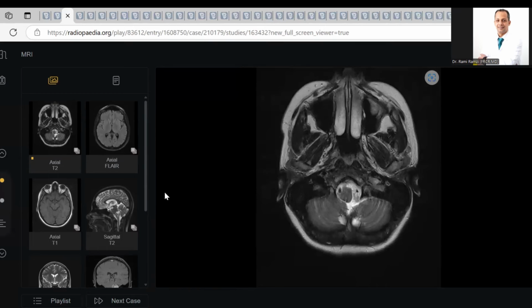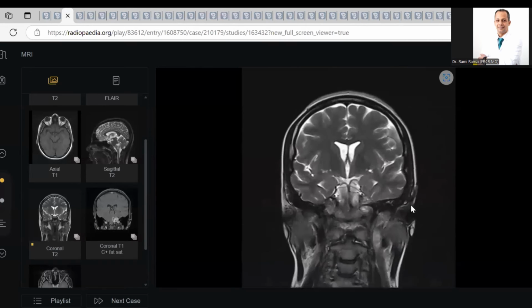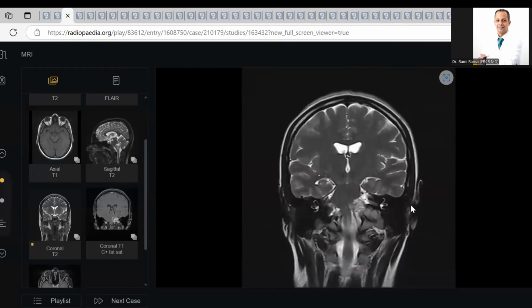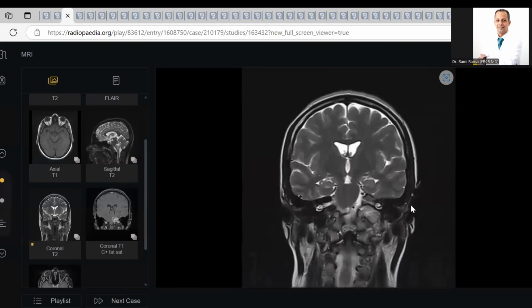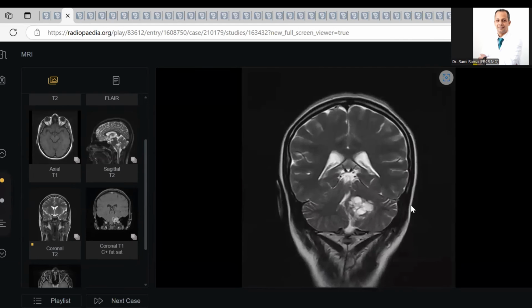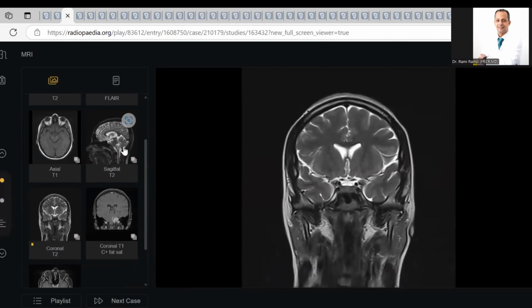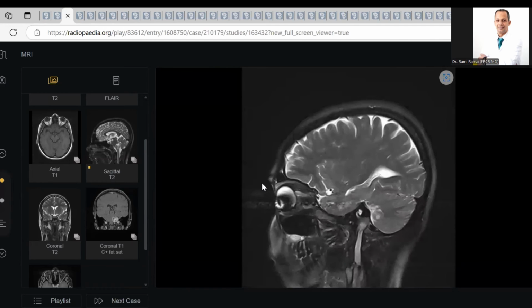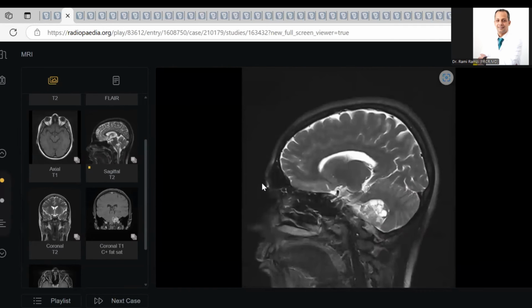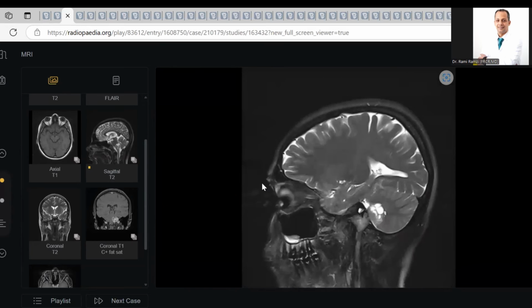Second point, you didn't talk about the skull base. This is the most differentiating point between schwannoma and metastasis and lymphoma. You should tell me there is destruction. Whatever you wanted to tell, but at least inform the examiner about your safe procedure. I'm checking whether this is an aggressive lesion or non-aggressive.